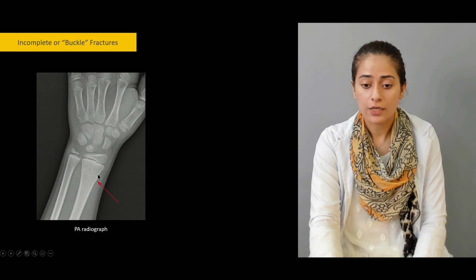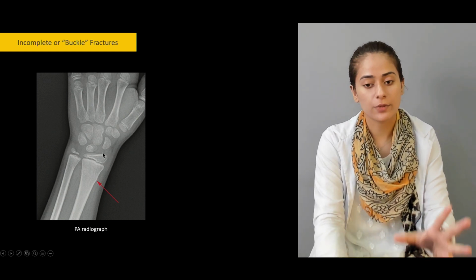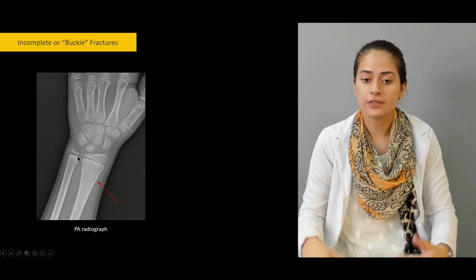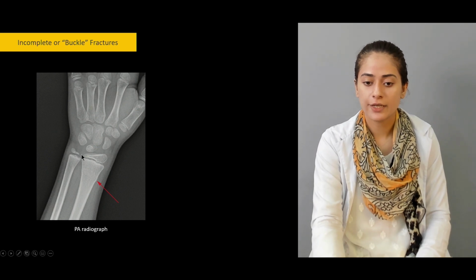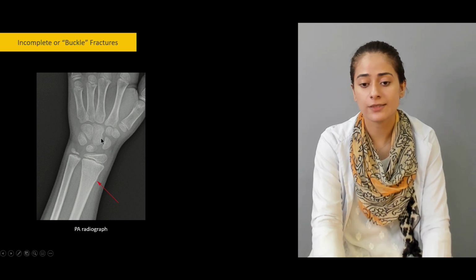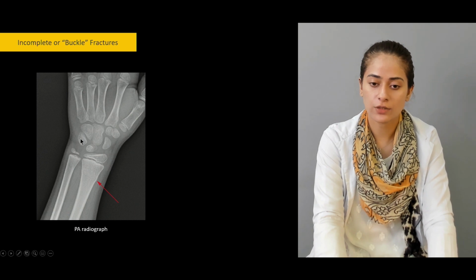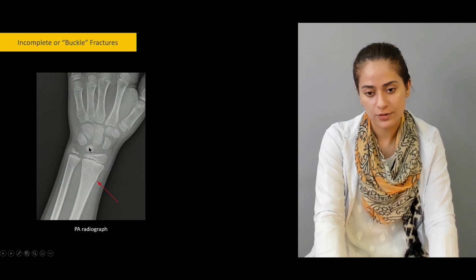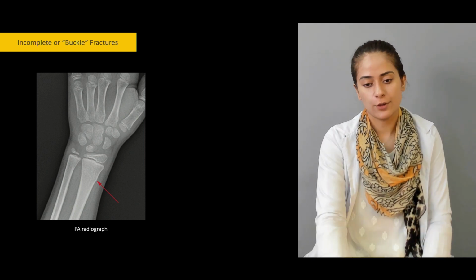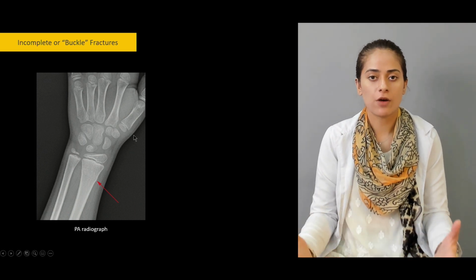So like I said, it's common in the neck. So this is the neck of the radius, and also because it's common in children, the bones have not completely ossified, as you can see here and here. So this is a child's radiograph, child's x-ray. Is this kid above the age of 12? All the 1, 2, 3, 4, 5, 6, 7, oh, actually these are 7. So this is probably a kid below the age of 12. If there were 8, then the kid would probably have been somebody above the age of 12.